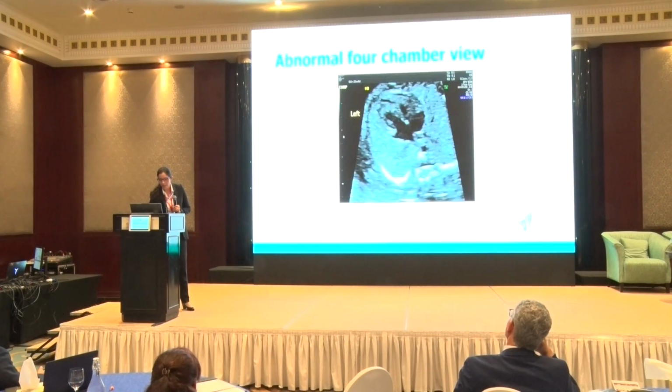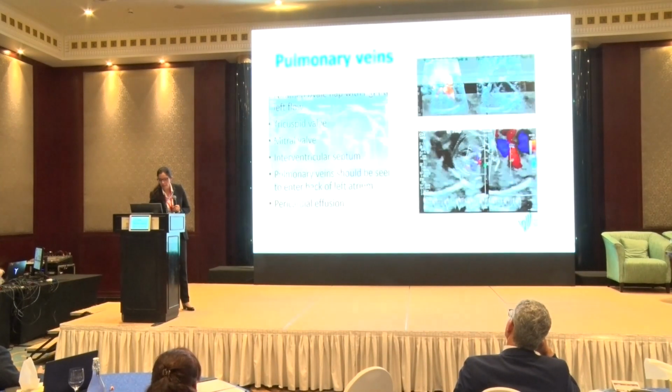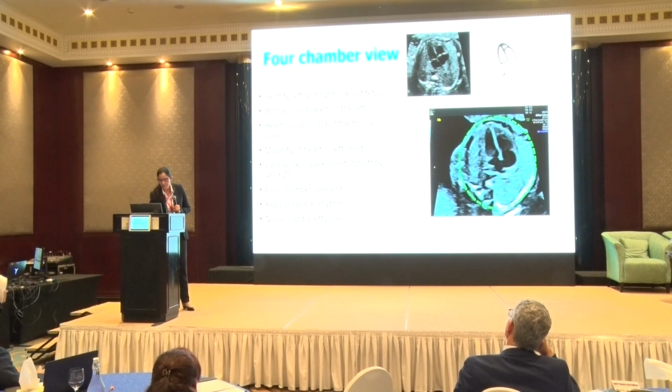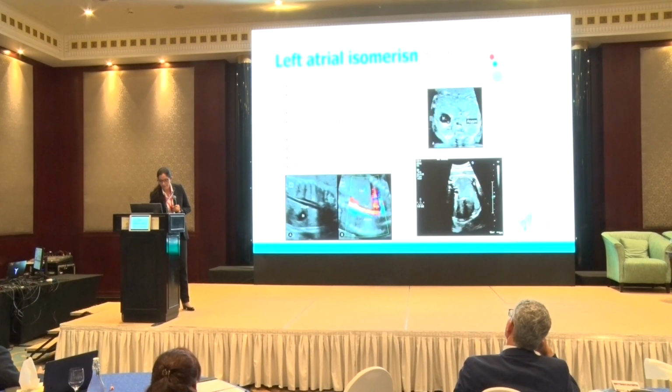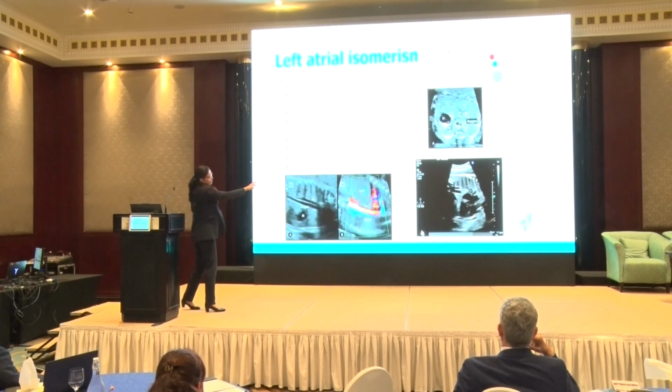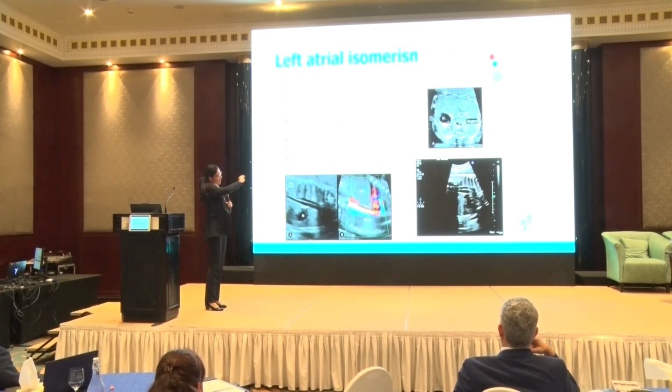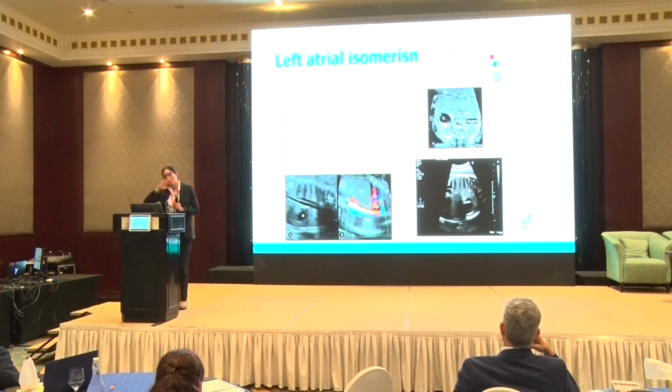So if I go back to my isomerism talk, this is the same patient. You can see when you follow both vessels, how they go, how you have this aorta, and behind you have the azygos. I don't have my computer, but I have it in color, showing similar to what you showed, so it's the same image.